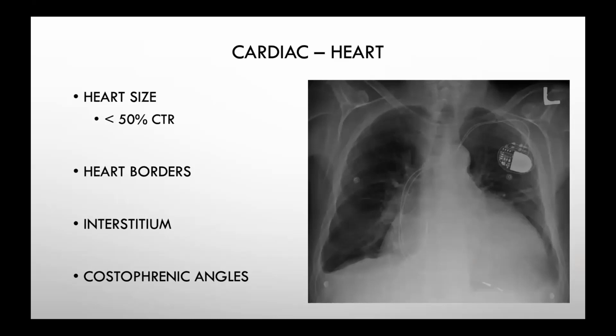I don't think you'll get as many cases that are as clear-cut and cardiac as this one, but they do illustrate the points well. So you can see that's the thoracic width, and that's what you're measuring to look at your cardiothoracic ratio. And clearly the red arrow is more than 50% of your blue arrow. And then the other markers as well, he's got a pacemaker. You can't really see either of the costophrenic angles, they're blunted, and he's got some fluid in that last little oval in the middle of the picture. You can see there's a line cutting through the lung. That's fluid in the interlobar fissure, in the horizontal fissure.